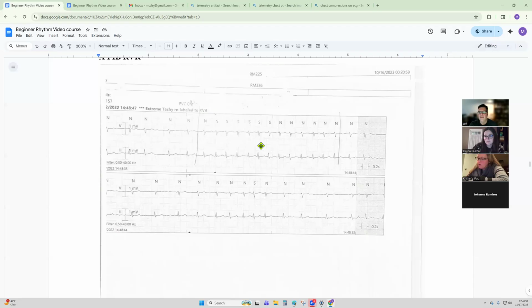It's kind of like the difference in atrial ectopic rhythm, right? You have 2 different P waves, where one's coming from the SA node, one's coming from the atrial chamber. You're not going to call that PACs because they're not excited cells. Where a PAC, you're going to have an early P wave, early QRS complex. Those are excited cells.